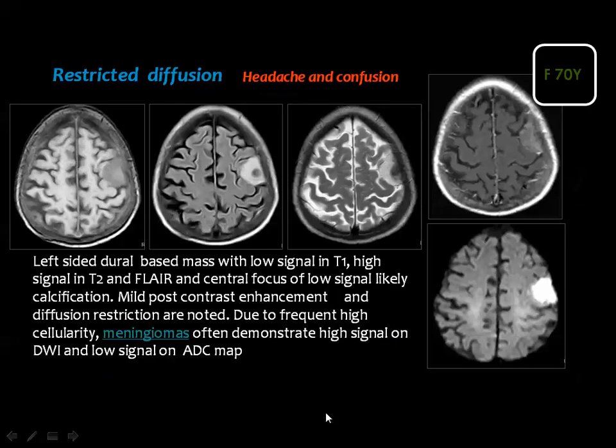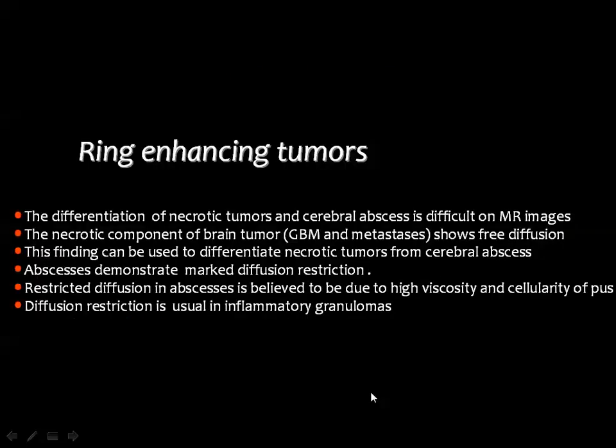lesion with restricted diffusion. Another case of meningioma, convexity meningioma on the left side, T1 and FLAIR, and T2 weighted image, and T1 post contrast, homogeneous enhancement, diffusion weighted image, restricted diffusion.